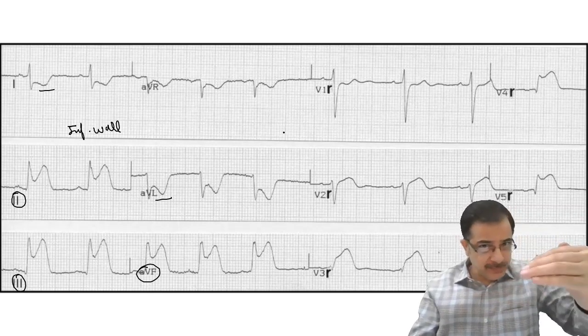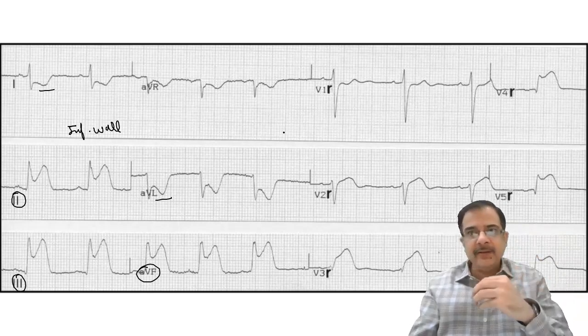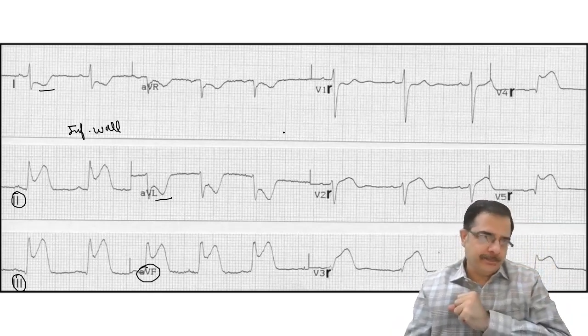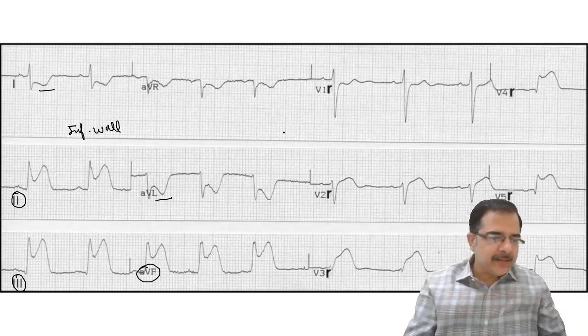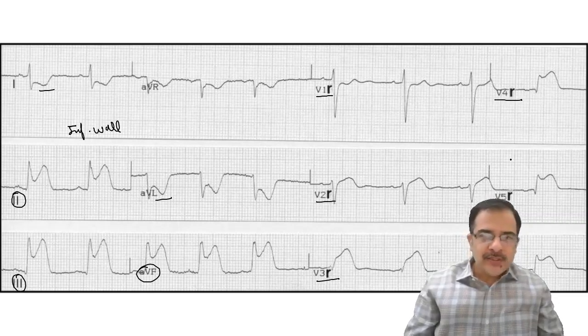You can think of the blood supply and identify whether inferior and lateral wall both can be affected or it will be a coincidence, but that coincidence will be less. So always justify the answer with a common artery. Inferior wall is supplied by the right coronary artery, and here the lateral wall is not affected. Look carefully, V1R, V2R, V3R, V4R. So these are right sided leads. The R word is right sided.